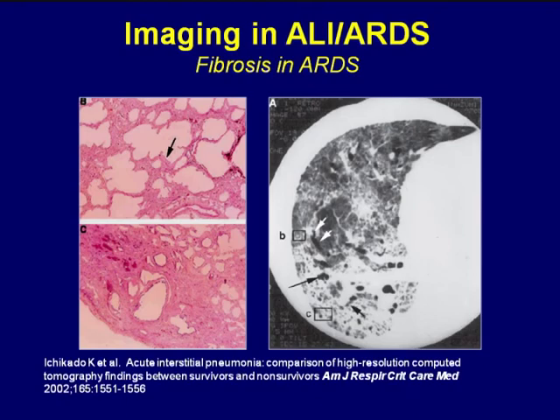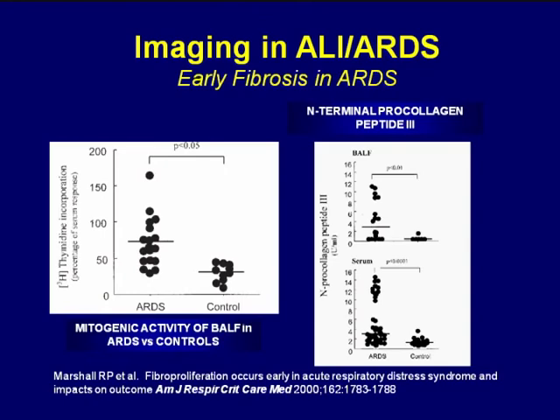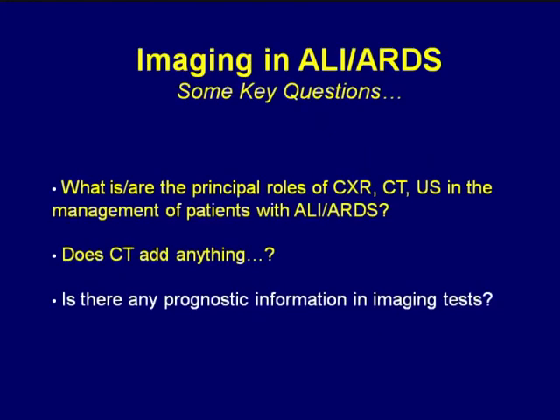Within the areas of ground glass opacification, there are some dilated airways, and that is important. And various studies have shown that whatever markers you use, there is certainly clear evidence of fibrosis in patients who do have lung injury. So this is a very intensely fibrotic or potentially fibrotic lung process.